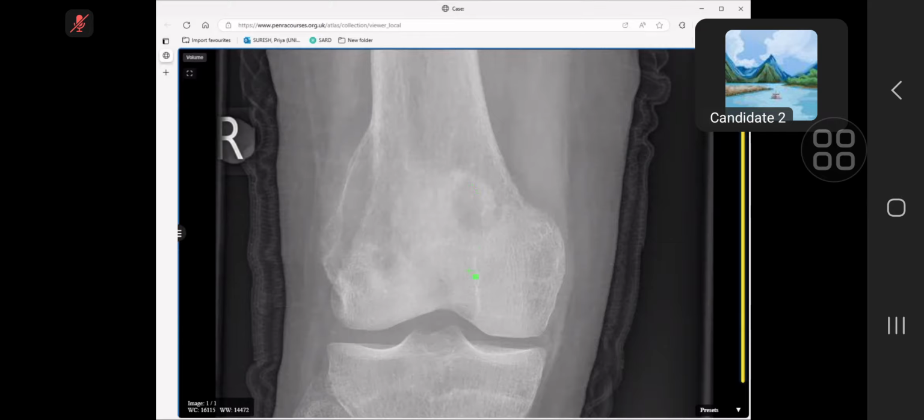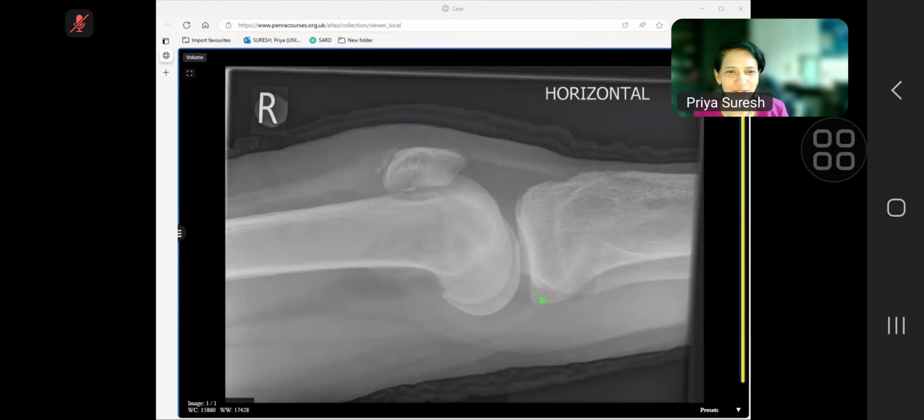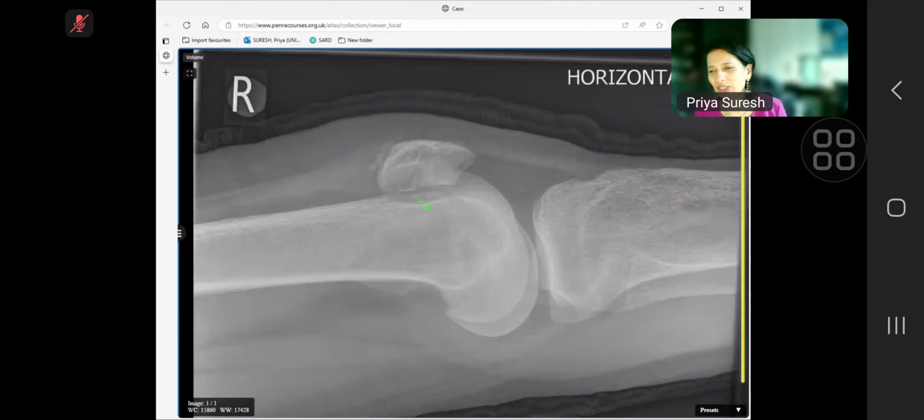Yeah, one here as well. And the more you look, the more you can, because you just wanted one more tumor somewhere, and you would have been happy to call it brown tumor, but actually they're there, and that's what I was trying to show. And I said it was a young patient to take you away from the fact that you are trying to say it is degenerative changes.